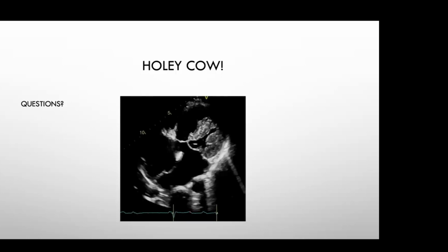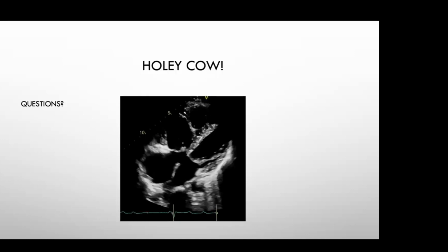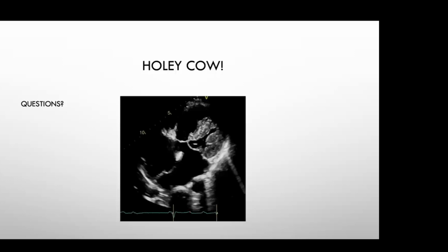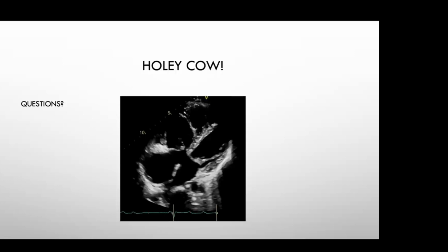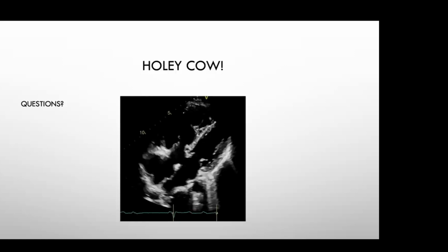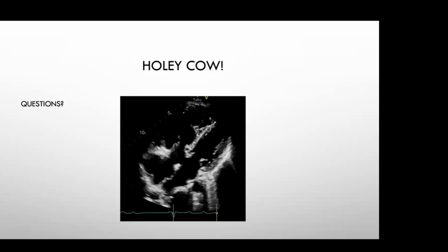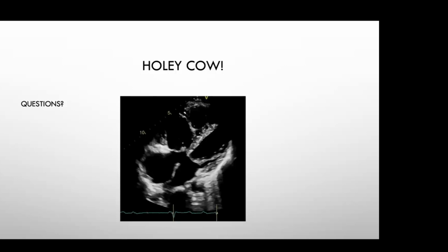So visual assessment of the RVOT. If you check the guidelines, there is proximal RVOT and distal RVOT. Even the proximal is from the parasternal long axis and parasternal short axis. There is a lot to count, even the mid. I think there are 7 parameters to assess the size of the RV. We are using only one, so be careful with that.